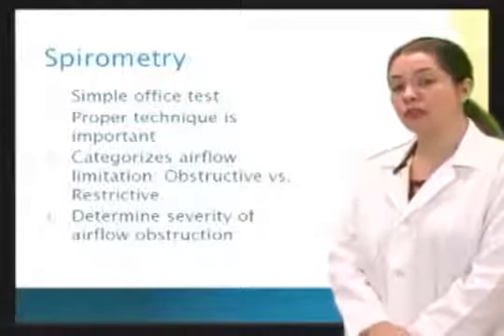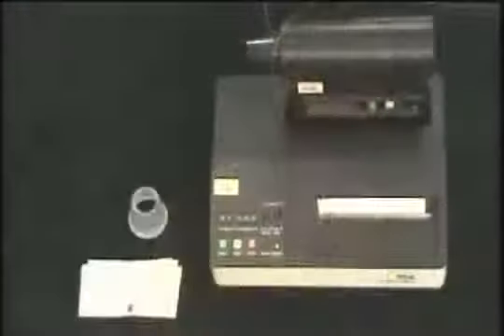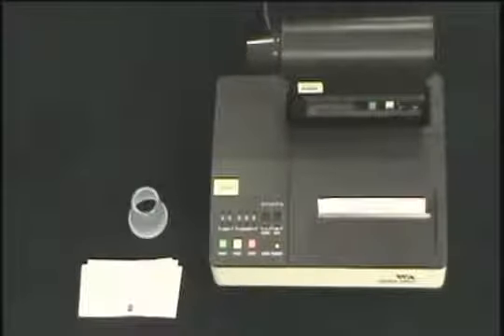We're going to go to Dr. Bruce Britton right here in the studio. I'm here to introduce the spirometer. Today we're going to be using a Welch-Allyn. It's an older model, but it records on paper someone's pulmonary function. We use this mostly in occupational medicine for surveillance for people who are around chemicals or other substances that might affect their breathing, to make sure that they're not being hurt by their job.